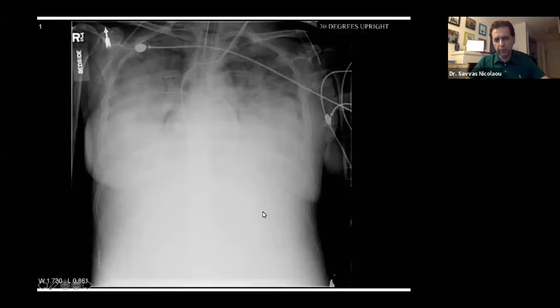Now, this is a radiograph performed in the CCU after a particular therapeutic intervention. This is an individual with a complete opacification of his right and left lungs, and he's been intubated with an ET tube in an appropriate position above the level of the carina, but also has a Swan-Ganz catheter, and centrally the catheter is placed within the central pulmonary artery in an appropriate position.